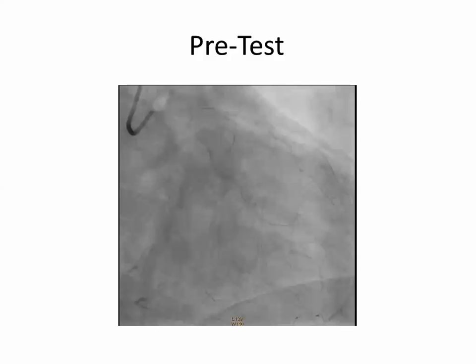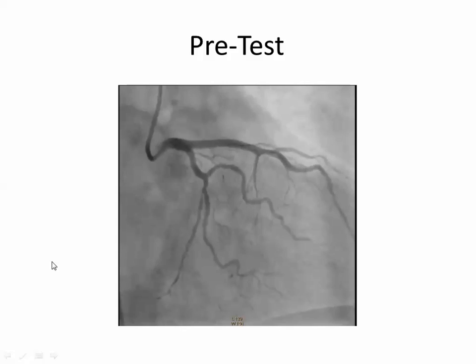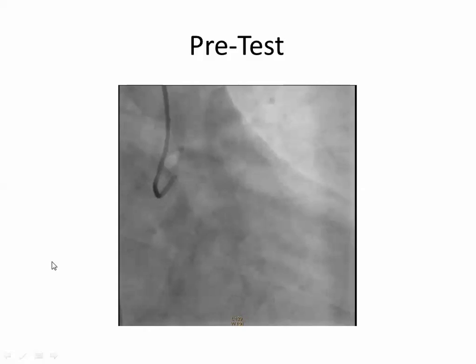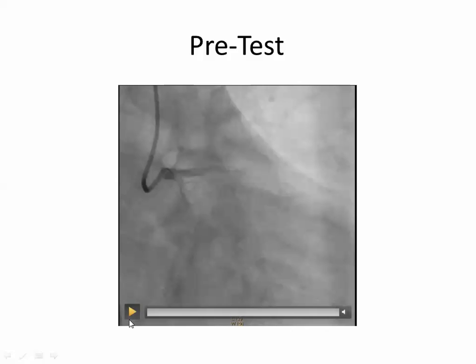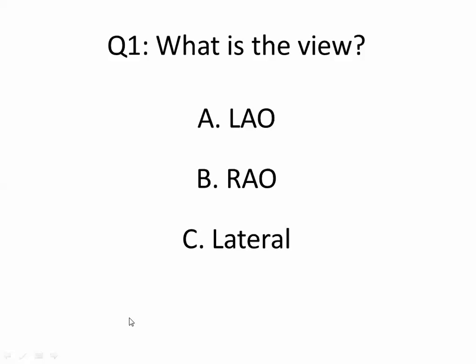This is a pre-test. Everybody has a pre-test paper. Look at the view, and there is a question after that. Which view is this? Simple question. What is the view?